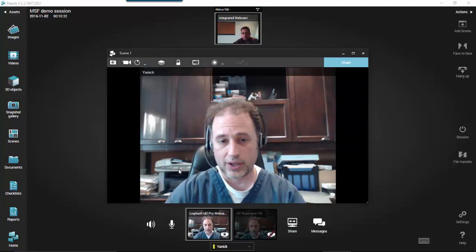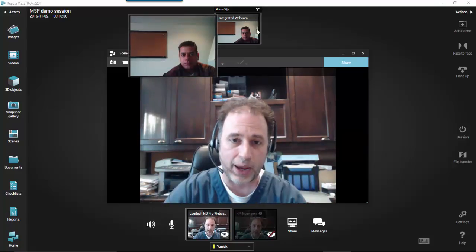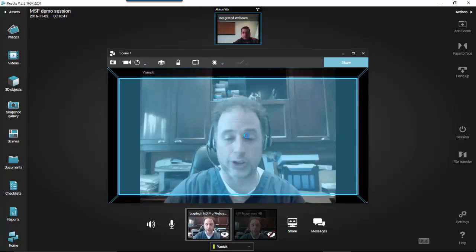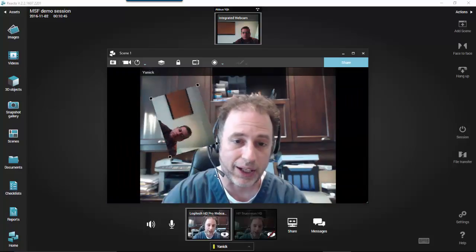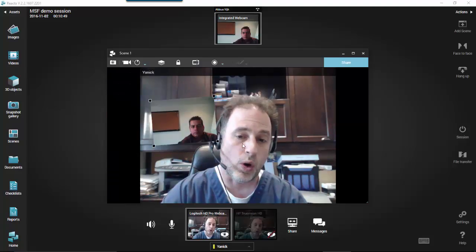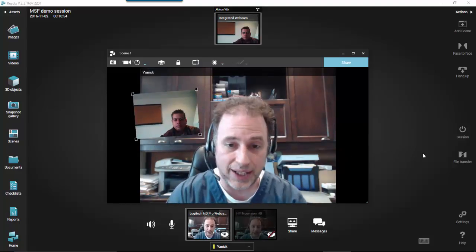So it's very intuitive. If I want to remove Aldous, I'm going to right click, go and delete it, and then it's gone. So if I want to now put Aldous more as a medallion, like a smaller camera, I drag and drop it in the middle. When you drag anything in the middle of a scene, you can do what you want with it. Now I'm playing with my mouse, so I can rotate the camera, put it smaller, bigger. Okay, you do what you want. And the two users can play with everything that's on the scene.